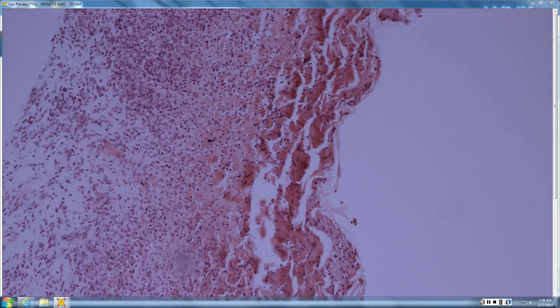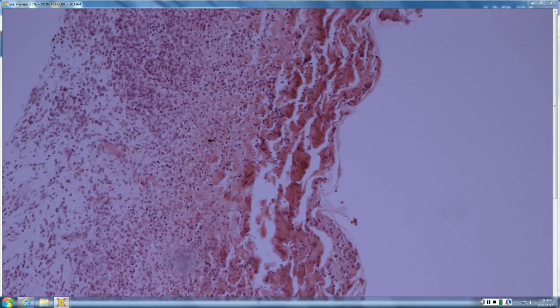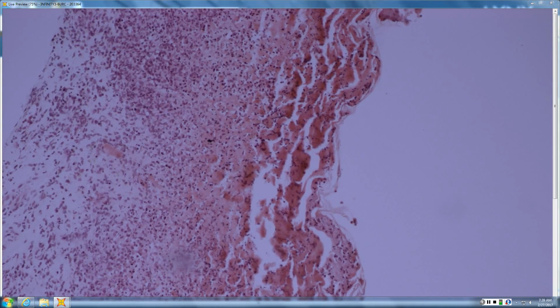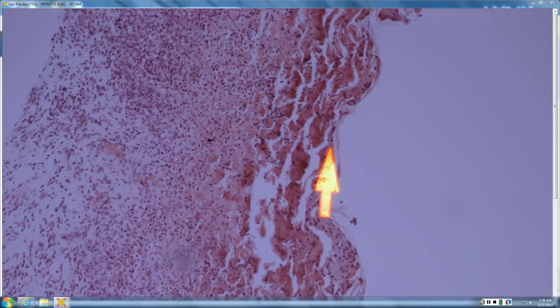Could be a herpes. Yeah, so suggests that they died via ballooning degeneration, where they are now big, circular, dead blobs of red, as opposed to confluent or net-like blobs of red. These died a ballooning degeneration death, which suggests herpetic change.